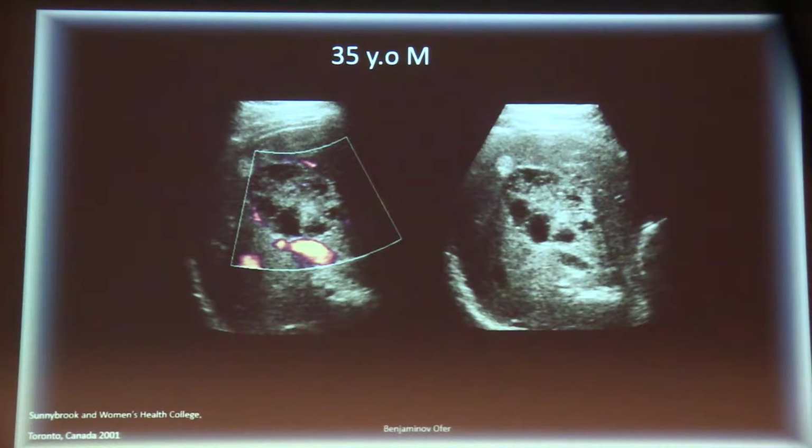Now here's a patient, 35 years old, who presents with an incidental finding. In his liver, there is, again, a well-circumscribed liver lesion. It has solid components, it has cystic components, no vascularity, and one of the differential diagnoses did include Hydatid cysts. However, this patient is known to have neurofibromatosis 1. This was biopsied, and this turned out to be a plexiform neurofibroma.